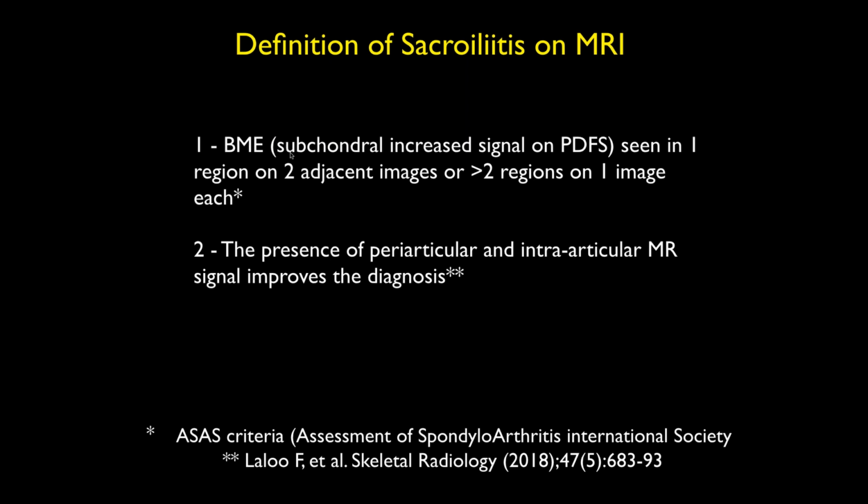It's called bone marrow edema in a lot of the literature, but often it's not edema. Often it's just replacement of the marrow fat with inflammatory cells, and therefore you don't have to have true increased fluid in the interstitial spaces. So I don't like this term bone marrow edema, but it's throughout the rheumatologic literature in this particular area.